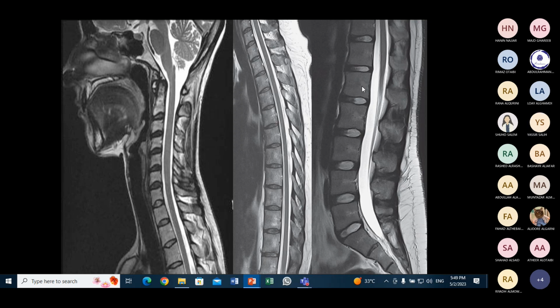Vertebra. Vertebral body. This is a body. Yes, the vertebral body. What is this? The disc, doctor. This is the disc. Please look to the disc at normal appearance. The disc in T2 should be white, hyperintense. ليش؟ لأنه هو containing gelatinous fluid اللي هو nucleus pulposus. Nucleus pulposus containing gelatinous fluid material, so it appears hyperintense, normally hyperintense. If it becomes hypointense or flat, this indicates abnormality.